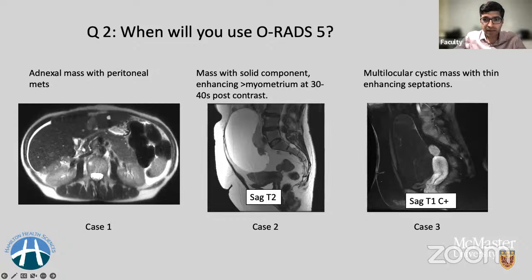Okay, so we have a little bit of a split in this case, right? So you can see some of you have gone for A, most of you have gone for B, and some for C. Okay, this is very good. So this is going to help us for the discussion of today's talk.